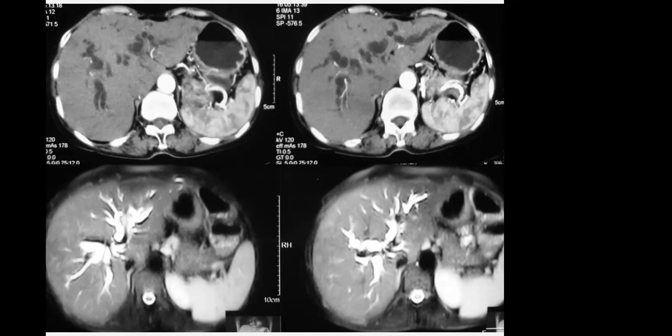True. So perfect. In a normal CT scan of the liver, we don't see the hypodense bile ducts because they are actually collapsed. If there is no biliary obstruction, the bile ducts will not be dilated, and we will not see this type of dilated hypodense track-like structures. So there is some abnormality, and it is dilated obstruction. Somewhere there is obstruction of the bile ducts, ductal channels, and intrahepatic biliary ducts are dilated.